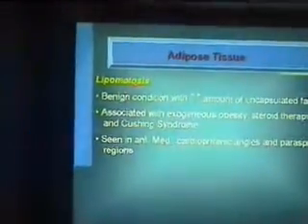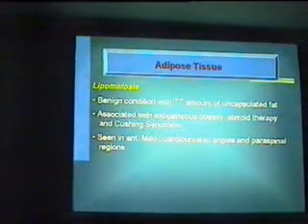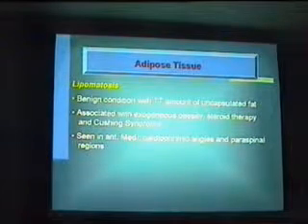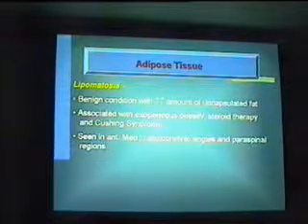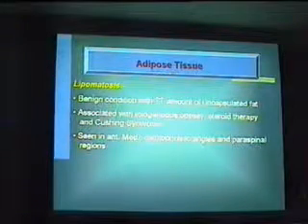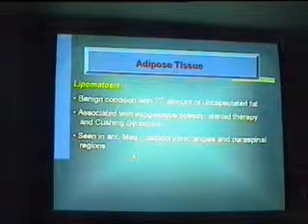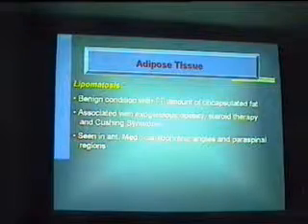Now we come to lipomatosis. By definition it is a benign condition with an increased amount of unencapsulated fat. Why unencapsulated? Because the fat that is present in the mediastinum is unencapsulated. Okay? Nothing happens except that this amount increases a lot, and we call it lipomatosis. It is usually associated with exogenous obesity, as the doctor was asking, or steroid therapy or Cushing syndrome. It is seen in the anterior mediastinum and in the cardiophrenic angles and paraspinal regions, so it is present in all the spaces. Okay?